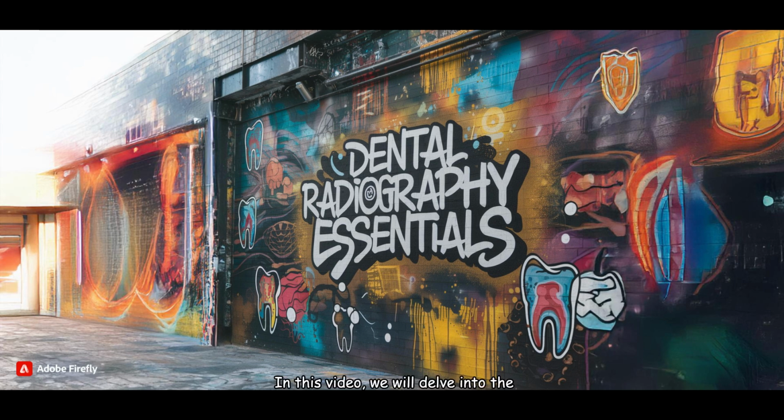In this video, we'll delve into the essentials of dental radiography, exploring the principles behind radiolucent and radiopaque structures, key landmarks visible on radiographs, and the interpretation of these images.